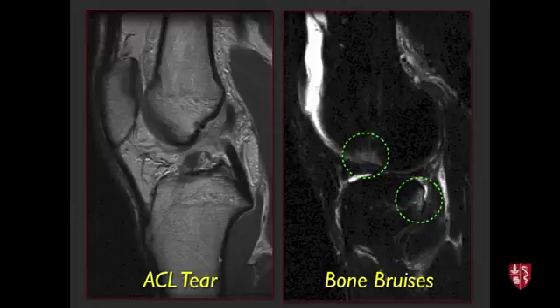So why is that important? Well, the main importance is that we don't always have video, although more and more we do, it seems like. But if we see these biomechanical footprints on the MRI, we can back construct the injury. We see this all the time. It's like, oh, that bone bruise pattern looks like a hyperextension injury, or this bone bruise pattern looks like the patient had a patellar dislocation. Many things that may not be clinically evident, or the patient may not remember.